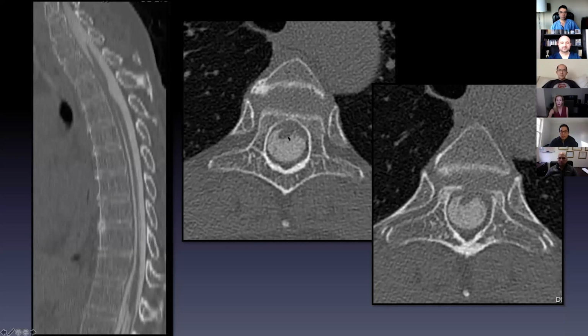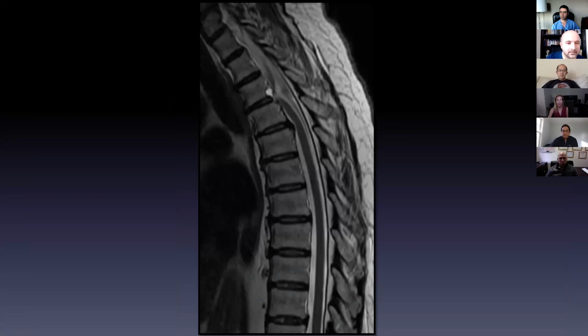One other big clue that I've found is helpful, although I haven't seen that many, the cord is rotated. Cord rotation generally only happens when it's being herniated through the dura. So in this case, I would say that. And I think Dr. Bosch told us it's important to know the difference between the web and the herniation ahead of time for your surgical planning, right? Yeah, okay. So here's a more blatant case.